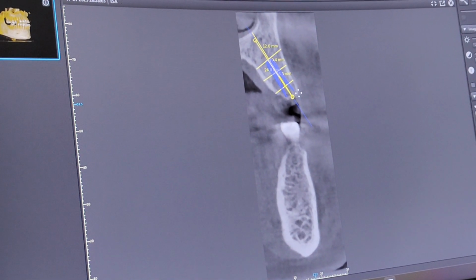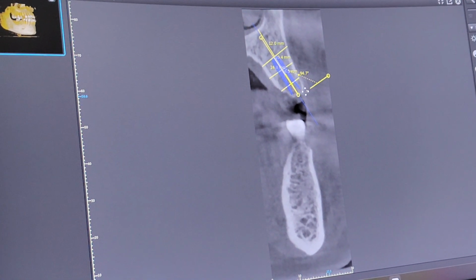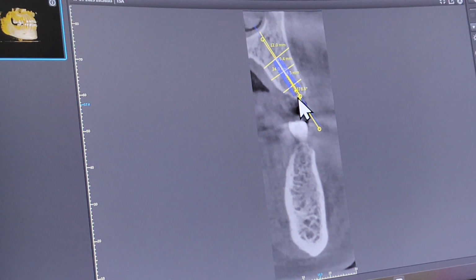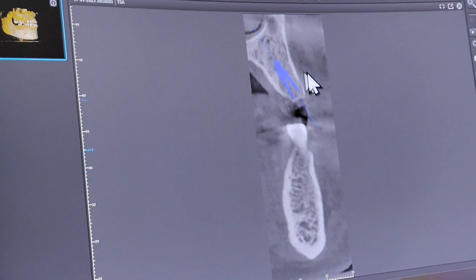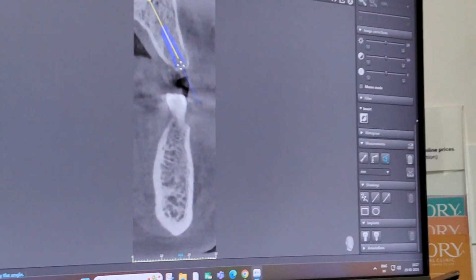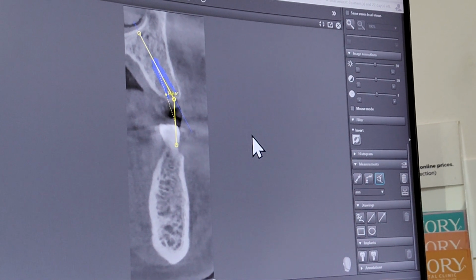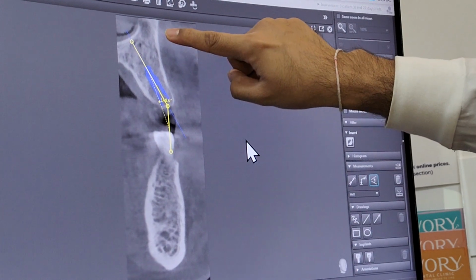Second click and third click will be at the 90 degree. Here we get this. Fix it like that. You have this, and then we have this. So occlusal plane से किस degree में? Okay. So if we were to go straight, we would come out from the buccal, right?